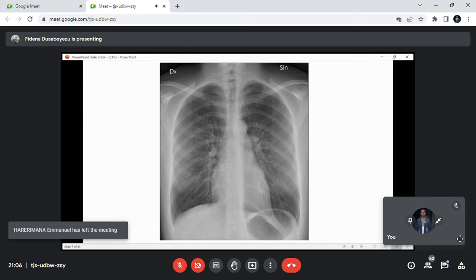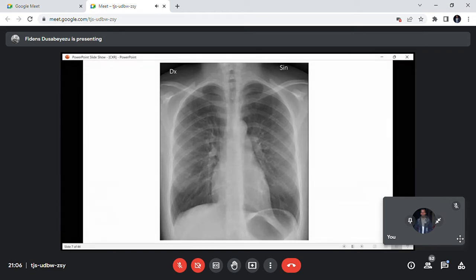You can see, like in achalasia, when there is an obstruction of the esophagus, the proximal part is dilated. When it is there, you can diagnose it in front of you like this. You can see the esophagus with an air fluid level. What you have taken as food or drink doesn't go to the stomach, and it makes an air fluid level. Okay. That's number one among four.